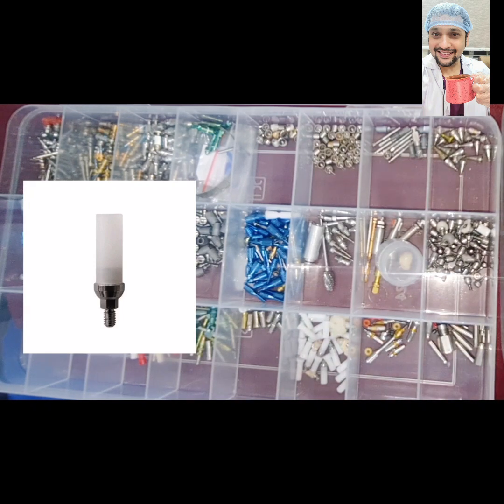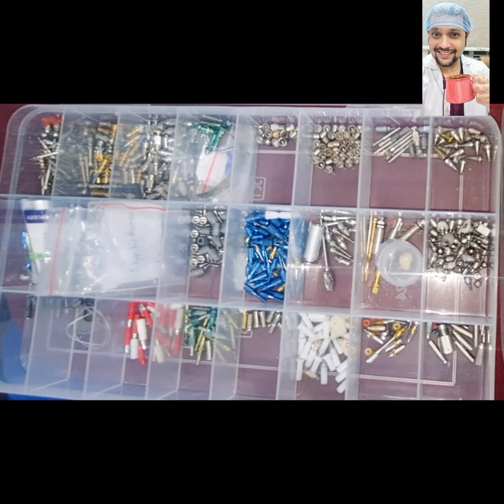So this is usually made for a casted prosthesis. So when I use a UCLA abutment, you get casting over the prefabricated base, and after that you can layer with ceramic. So this can be used for a screw retained prosthesis. This can also be used for a cement retained and screw cement retained prosthesis. This is what we need to understand from UCLA abutment.